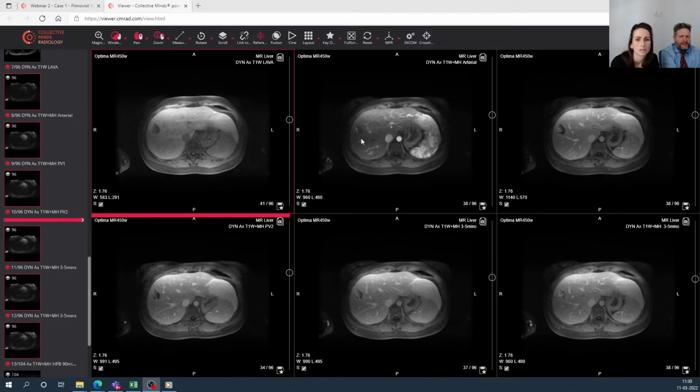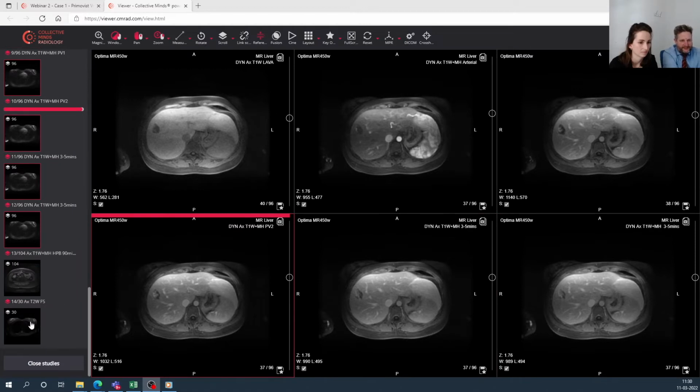Heavily hypointense. Yes, exactly. And then when we look at the arterial phase, we can see some enhancement here, peripheral. And when we have a look at the later phases, the enhancement progresses inwards. I think it has a nodular pattern. It's discontinuous. So I already had an idea what this lesion could be. But wait. Before saying the diagnosis, it's quite a clear case, but we didn't look at the T2. We always look at the T1 and the T2. That's the most important sequences.